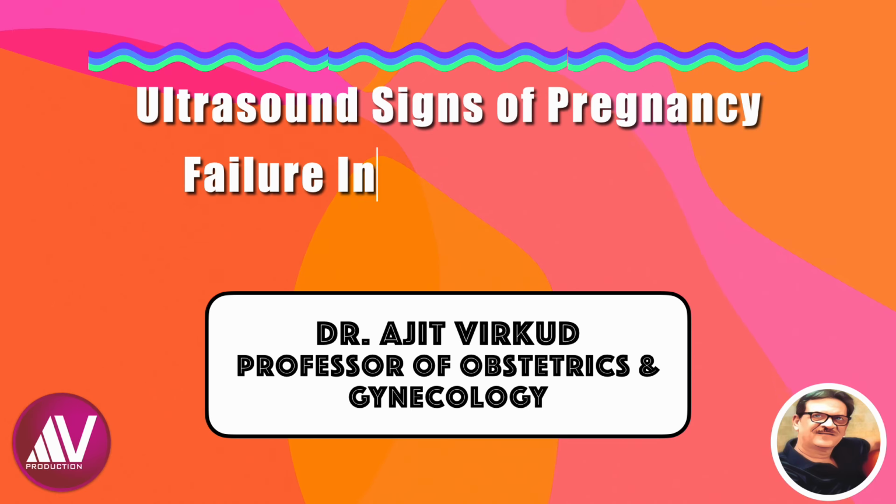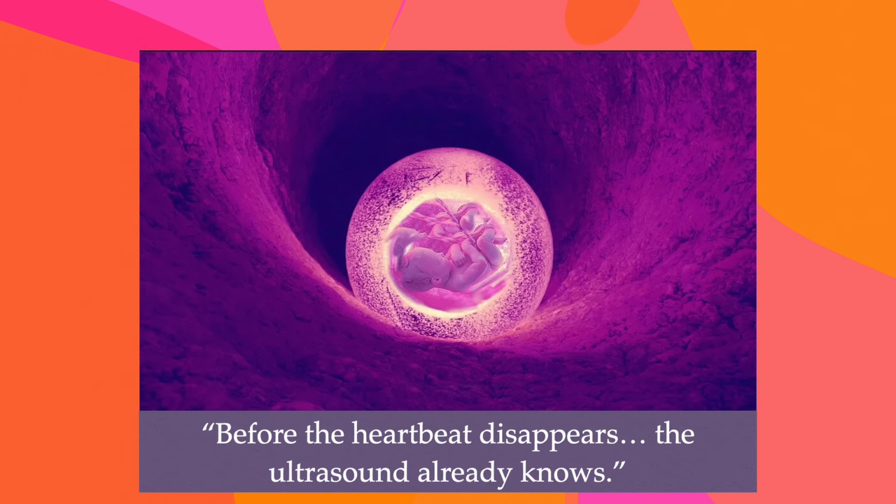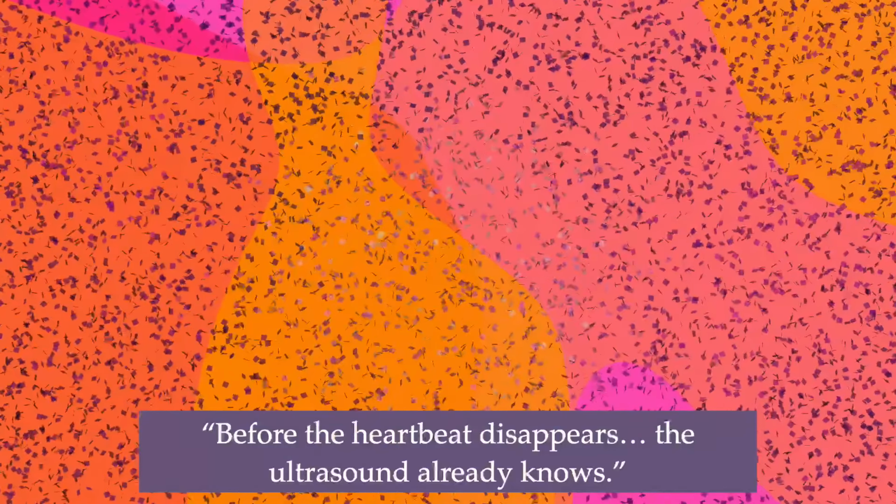Today, I am going to discuss ultrasound signs of pregnancy failure in early pregnancy, a simplified ultrasound approach. Miscarriage isn't sudden. Its warning signs appear weeks earlier on ultrasound. When early pregnancy stops developing, the scan tells the story first.